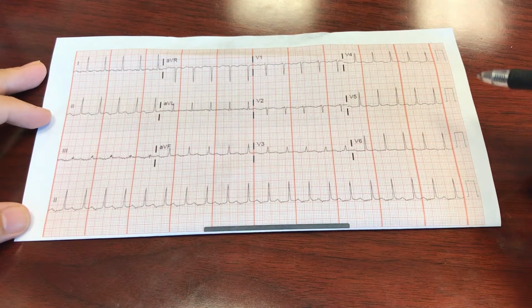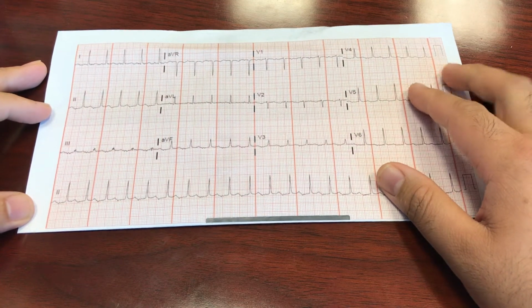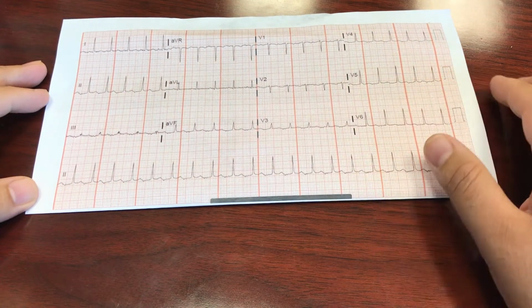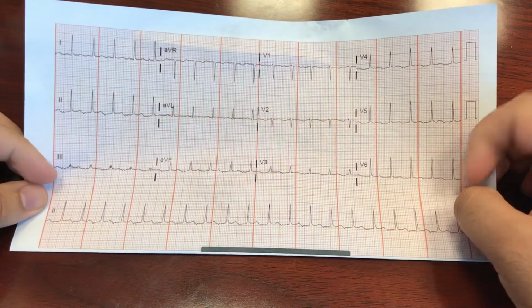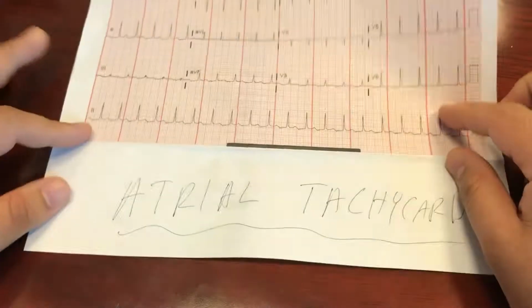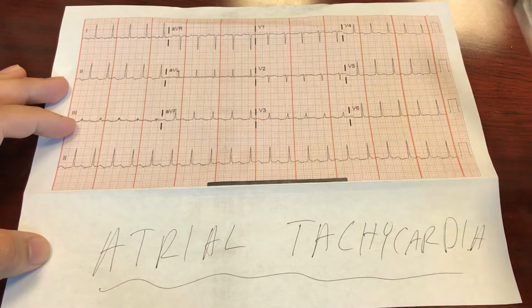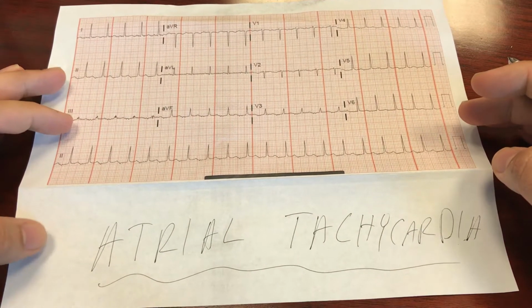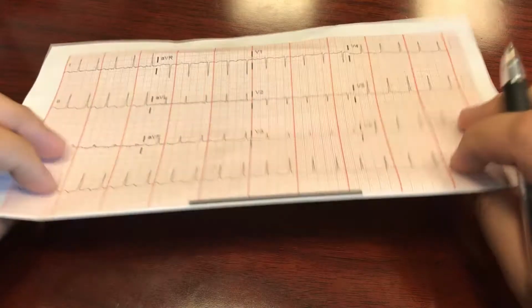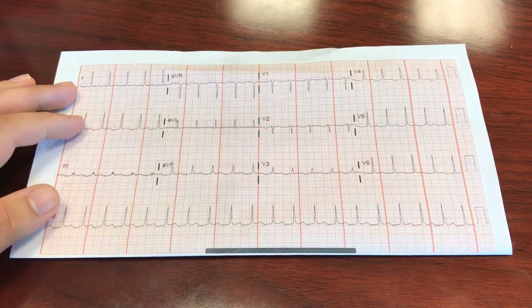All right, everybody. Here is the answer to the EKG Facebook stumping contest, I guess. So far we had some good guesses, but the correct answer is atrial tachycardia. For those of you who came to the CE, what was it, two quarters ago, remember that I like to pretend atrial tachycardia doesn't exist, mostly so we can stump people on Facebook. All right, so what makes this an atrial tachycardia?